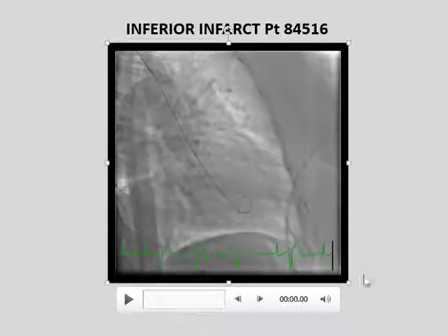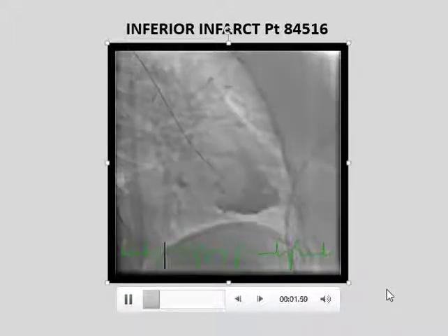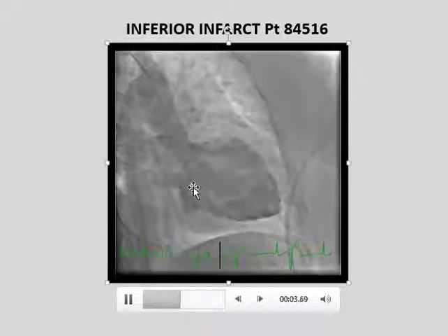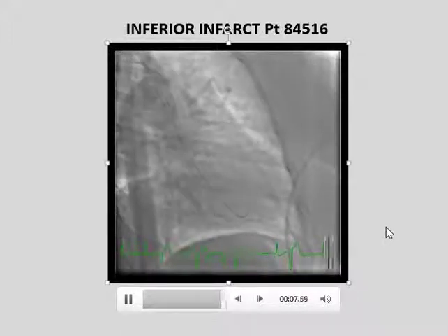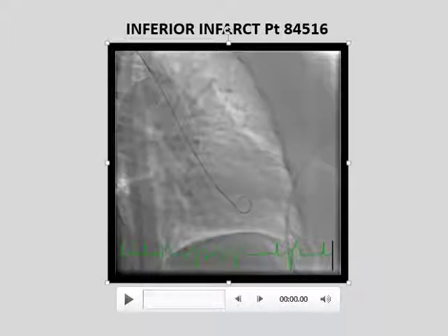My apologies, another slide that I did not put on repeat. I'll play it one more time. Just appreciate the sluggishness of that ventricle and the immobility, the relative immobility of that inferior wall where the right coronary artery would have suffered the insult, resulting in an infarct, permanent damage to the muscle.